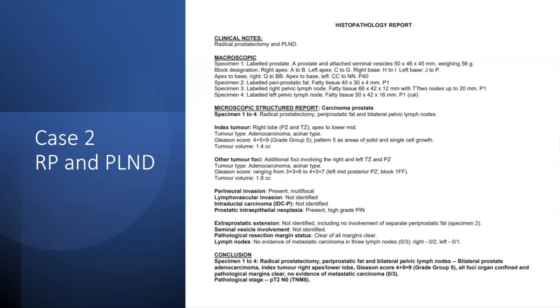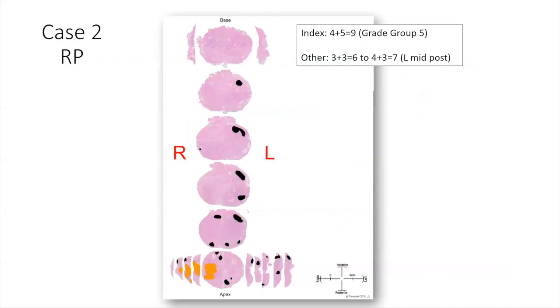Claire, what's your response? Did we put that into the transition zone when it's a peripheral zone lesion? Certainly all that apical looks peripheral zone to me, in which case obviously the diffusion is very positive. Yeah, so I kind of straddled it, and this is why I noted it. Yeah, so I think that was the MR mistake. I mean, obviously, seeing it from London with only those images, it looks like it actually was peripheral zone, in which case then the diffusion is very positive. That's certainly all those apical, that definitely looks peripheral to me.